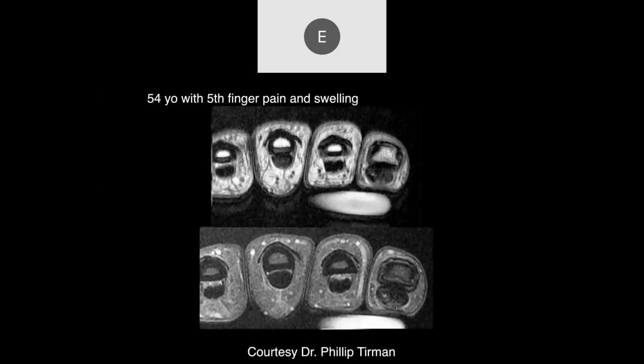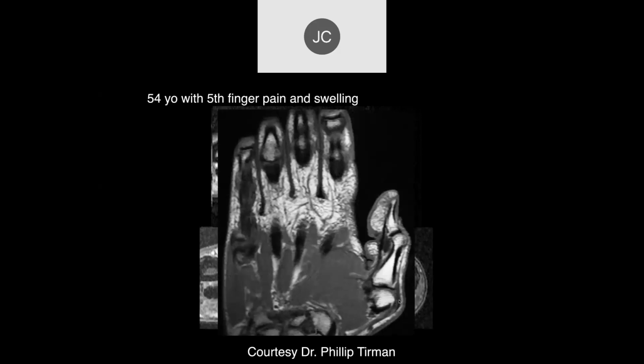When you see that one, it looks just very kind of bizarre. And I think we saw some where it kind of looked a little bit like this on the Achilles tendon when we did the ankles, also with gout. This was gout, also primarily involving the soft tissues and the tendon sheaths and the tendons.